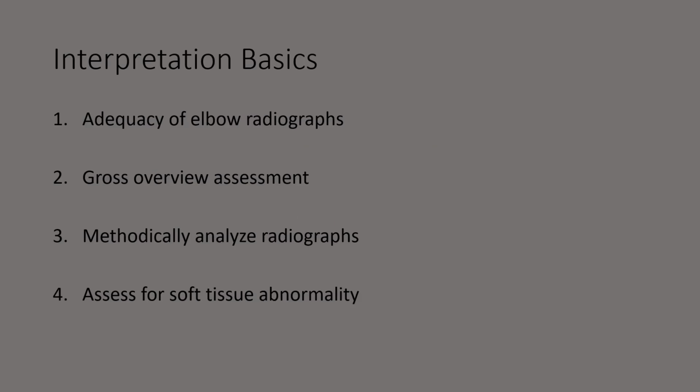Hi, welcome to this lesson on interpretation of pediatric elbow radiographs in the setting of trauma. There are 4 interpretation basics. First, adequacy of elbow radiographs. Second, gross overview assessment. Third, methodically analyze radiographs. Fourth, assess for soft tissue abnormality.